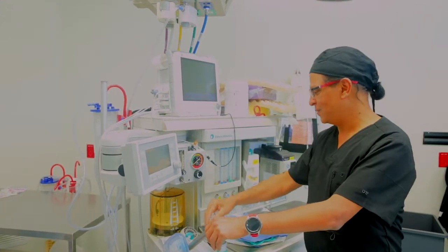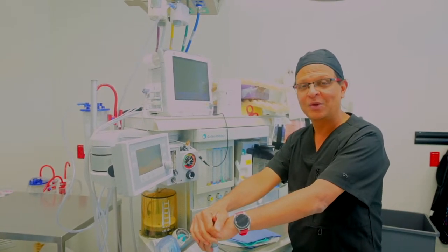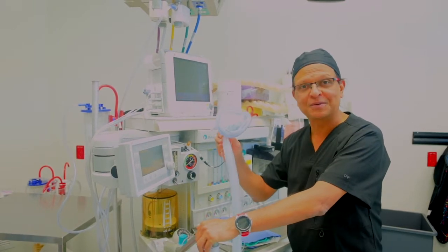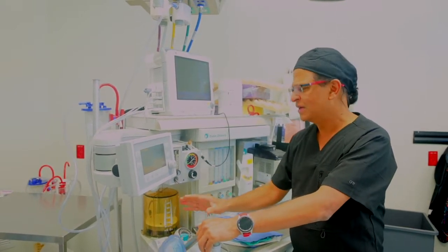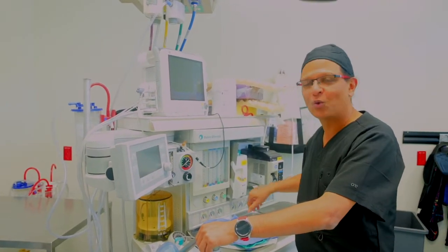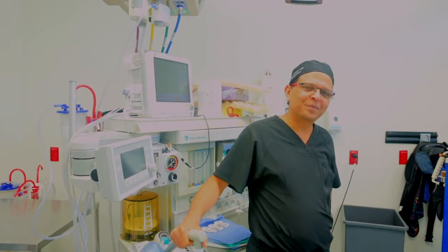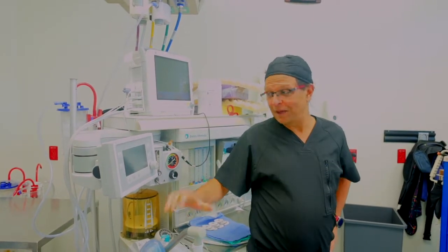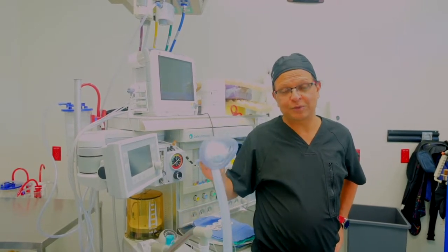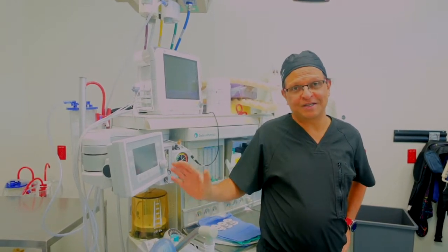Another very important thing is that I wanted you to hear this alarm. When the alarm goes off, usually when the patient is not hooked up to the machine, this goes off. This is something that you may hear when you walk in. When you hear that, it is very concerning and very alarming to the patient. Please understand, its real work starts when we connect the patient to this. Therefore, it is a life-saving thing for the patient's safety.